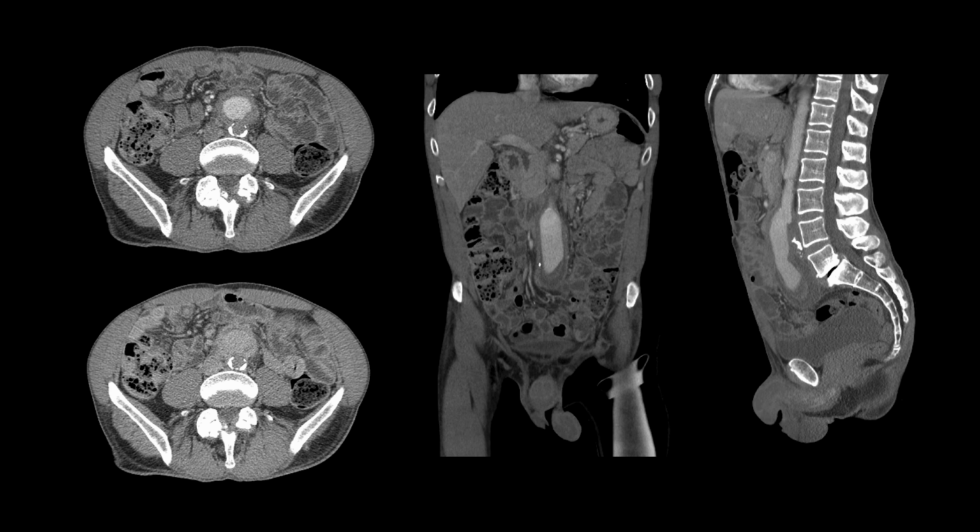Our first patient has an aortic graft, and they were evaluated with a CT. They were suspected of being infected. And here on the CT images, on the early images, we see abnormal soft tissue around the aorta. And so, this is the graft. Posterior to that is their native calcified occluded aorta.